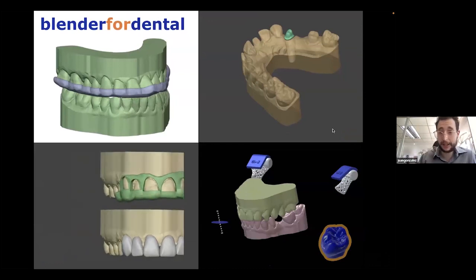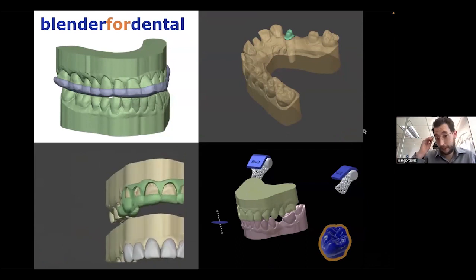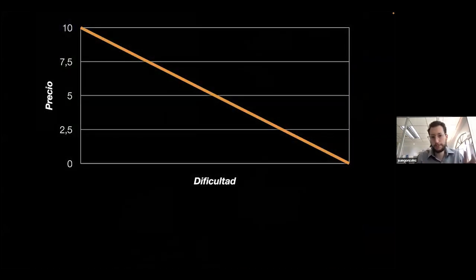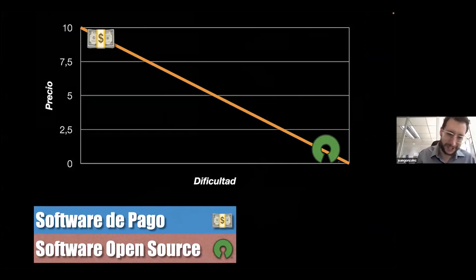So basically there are a lot of tools you can use, and in this workflow we were talking about today, which is surgical guides, you need to understand a lot of modules. That's why we are looking to explain the step-by-step of these procedures using different modules. Basically, we need the blockout, model designer, surgical guide module, and the alignment. We need all four to create those stackable guides or any sort of guide. So we're going to go step by step at a future time.